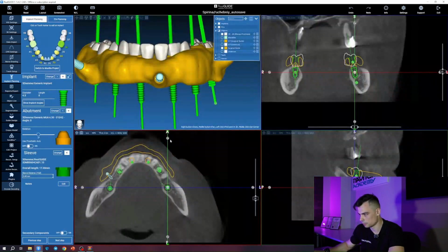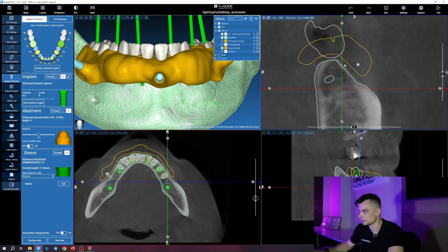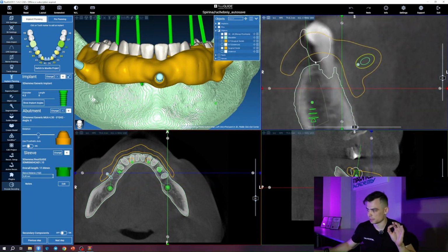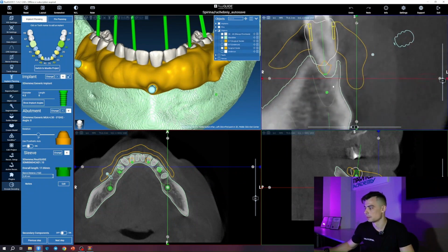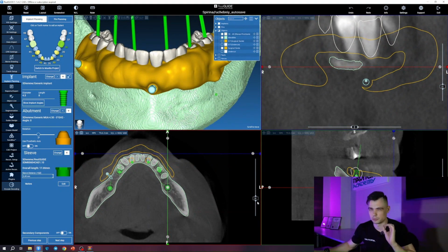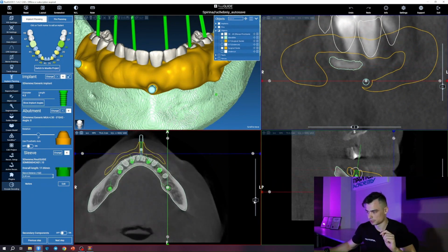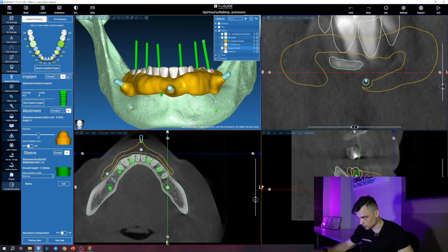and now what I wanted to show you is precisely this section. So you can see that there is a certain distance between the bone and the template. The template will be supported by these 3 fixation pins, and this bone here, more precisely, the template definitely won't press against the bone. Even if there is some inaccuracy, the template will most likely fit properly. Because believe me, if your template doesn't fit onto the bone, meaning you've extracted the teeth, and the template doesn't fit, it's very difficult during surgery to figure out where the template isn't sitting properly, where you need to trim, and so on. So how will the surgery proceed?